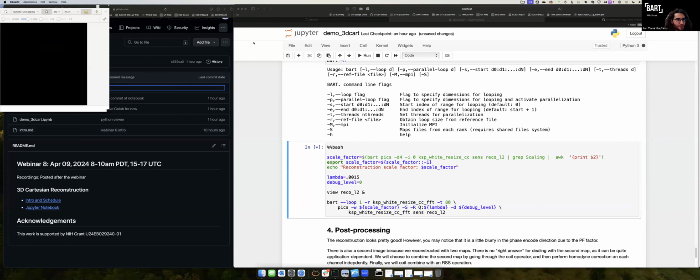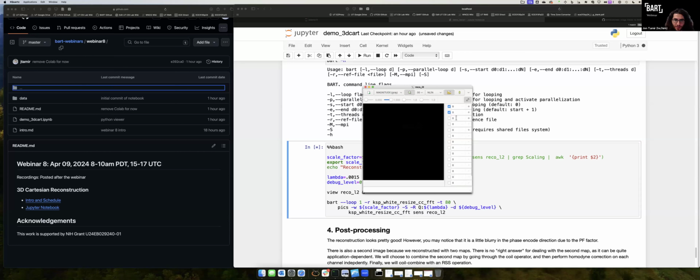Right here it is. So PICS is running. I'm just going to look through a little bit. You can see that I don't see the full reconstruction, but the slices are filling in as I refresh. That's because PICS is running in parallel and reconstructing each slice, and as it's done, it fills it in. And there, now my reconstruction is done. I know that went pretty fast. That's because we ran PICS in parallel, and it was just parallel imaging with L2, so each reconstruction was a small number of iterations. But it's another useful feature of the viewer that I can view the reconstruction as it happens.